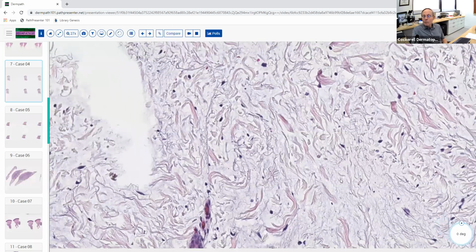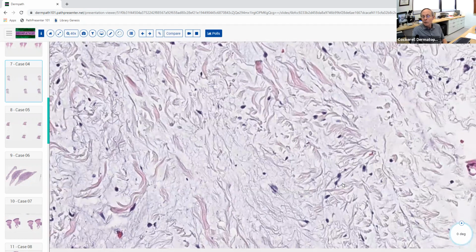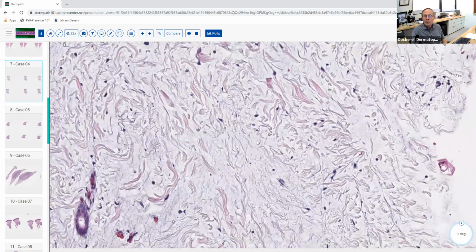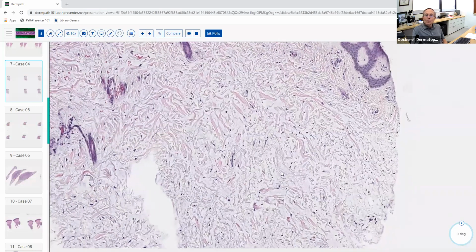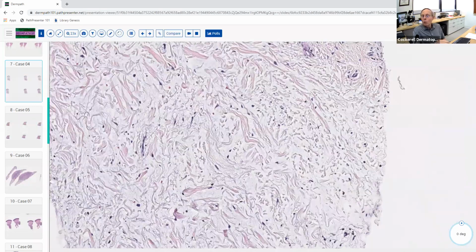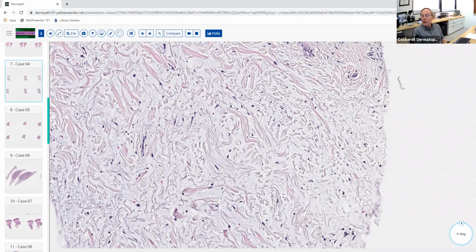And when you look at somebody that's got a pool of mucin in there, you're almost always going to see a couple of mast cells in there too. They just almost always go along with it. There's one other type of mucin though. What's the type of mucin that, when you get a cold, causes your nose to get stuffy? Is that produced by the lungs? I don't know. It's produced by goblet cells.